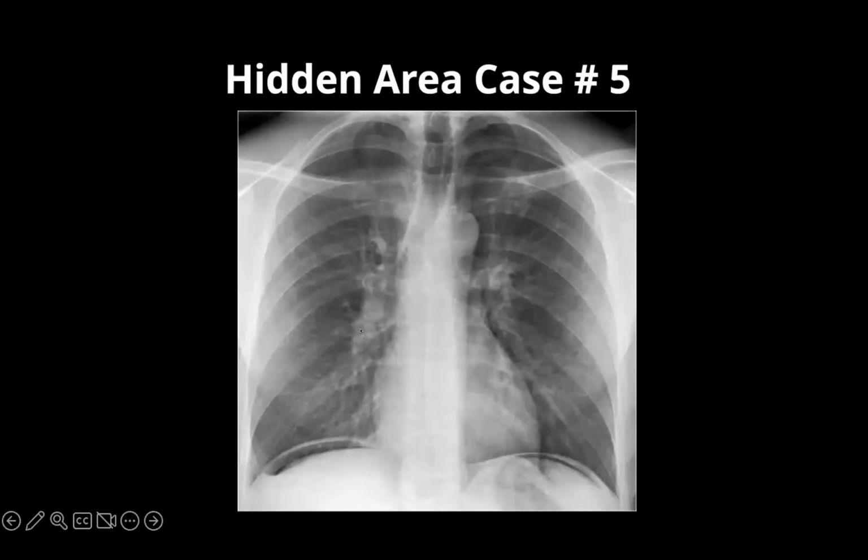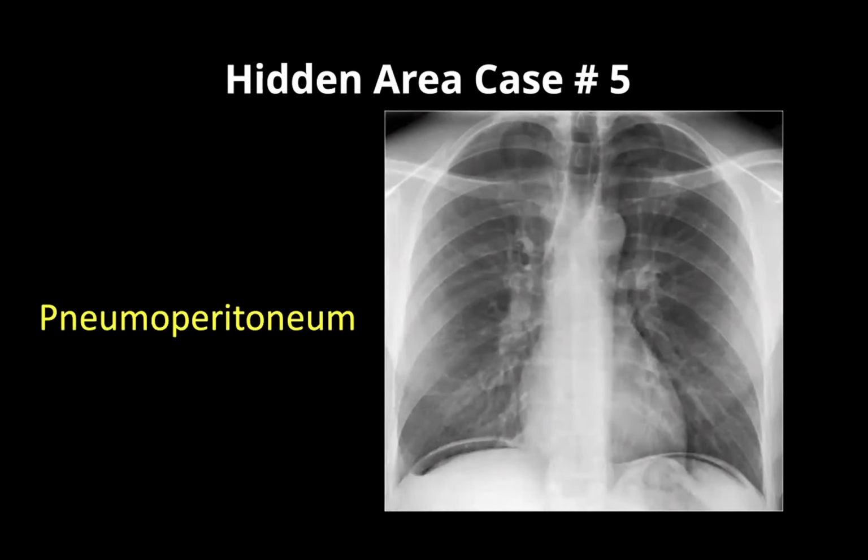And this lovely emergency case here, when you check your hidden areas and under the diaphragm, talking about the lung under the diaphragm and talking about free air under the diaphragm, we have here a pneumoperitoneum.